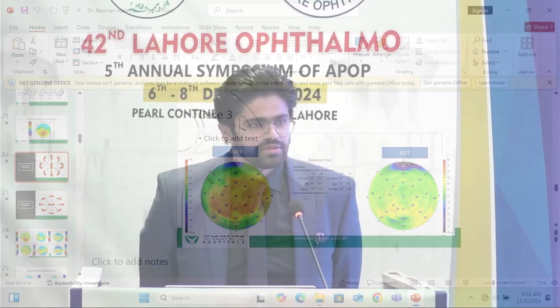So I asked her, did you look at the patient? She said yes. I asked her, what did you see in the patient? She said, I saw nothing. I asked her to go back and look at the patient. There was a subtle opacity right at the superior part of the cornea. That superior opacity had induced subtle scarring, and because of it the segmentation check was not good, so the superior steepening was actually not real. It was a fabrication based on what the Pentacam thought it was seeing. So yes, excellent point. Thank you very much, sir.